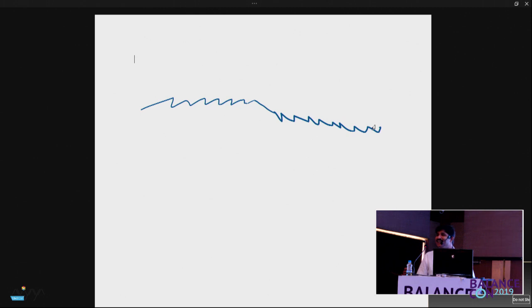Second, there is a direction change, and again there is a direction change. After the hit, if you see, sir, at 66 seconds there is a change from right to left. At the 66th second, there is a left beating, continuing to be left beating. But sir, at 10th and 22nd, you see, it is right beating, and it became left beating.